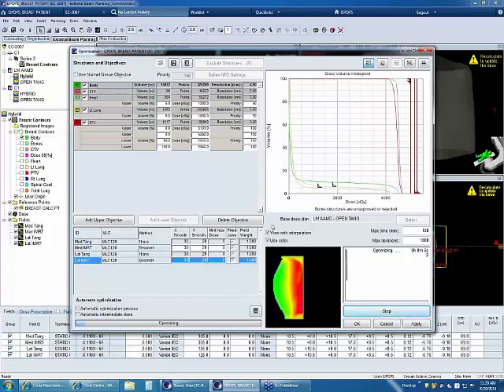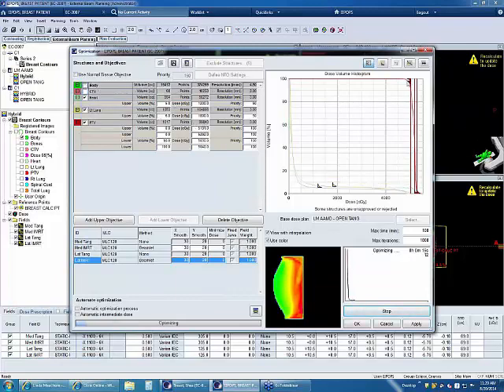Okay. So now it's optimizing. I can take off whatever I don't want to see. I don't want to see the body. I don't want to see the CTV. I want to see my PTV. All right. And here's my Fluence. I can go through both of the fields and show my Fluence as it's optimizing.